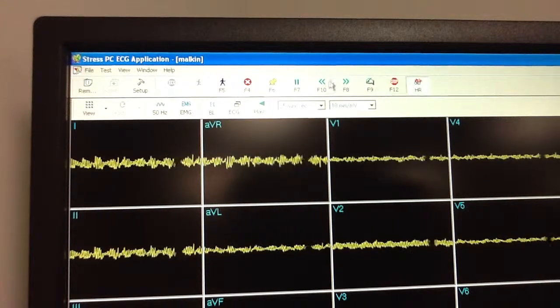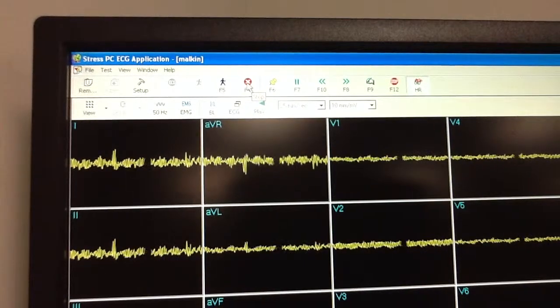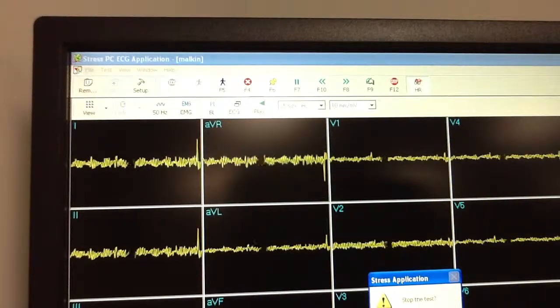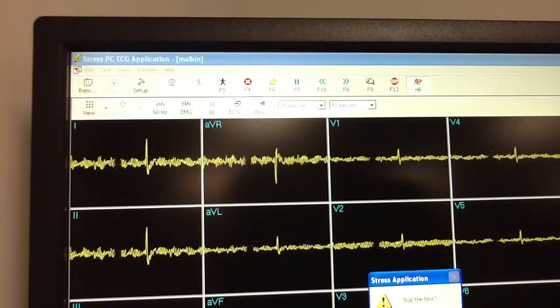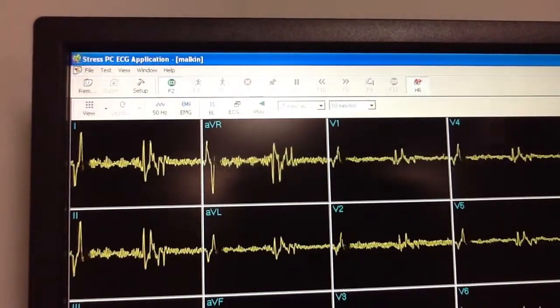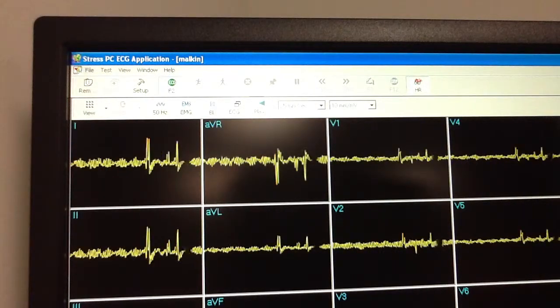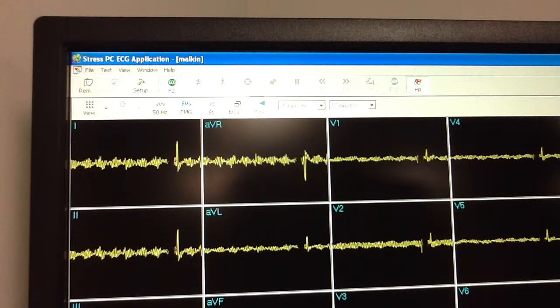So for the sake of this tutorial, I'm going to go ahead and press F4, and it's going to come up, do you want to stop the test? And we're going to press yes. And then now we're finished, the end of the test.